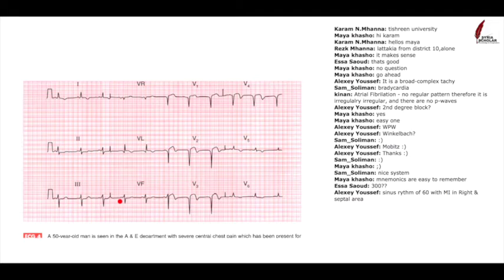Is this regular or irregular or regularly irregular? And can you see P waves? So let's say, can we see any P waves here? Are there any P waves?